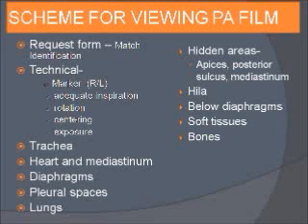Now, before proceeding to making clinical comments, we should analyze whether this X-ray has been optimally taken or not. There are many technical parameters which should be evaluated before commenting on abnormalities or before actually reading the X-ray. The most important thing is the marker. We should make sure that the marker is on the proper side, right side should be marked right side.